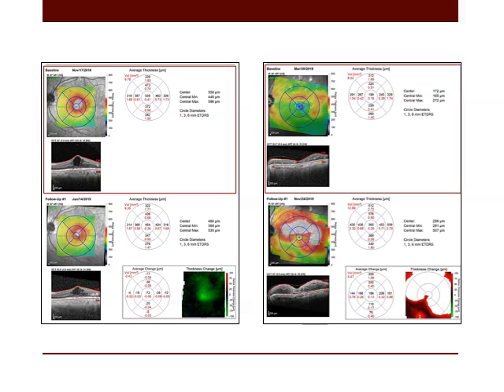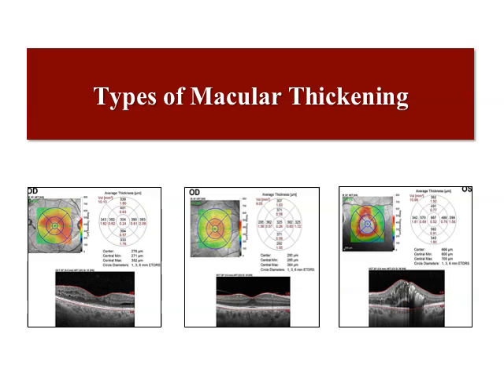For example, this is a baseline evaluation of the patient showing increase in the macular thickness with central involving cystic thickening. This is the follow-up scan for the patient with the thickness at this time, and the difference between both scans presented by minus, indicating that there is a decrease or reduction of thickness after treatment. On the other hand, this patient is presenting with nearly dry central macula. On follow-up, there is a starting serous elevation with recurrence of the small cystic and diffuse thickening of the macula.